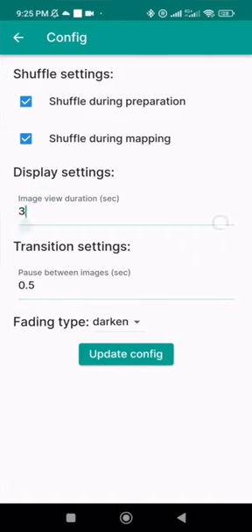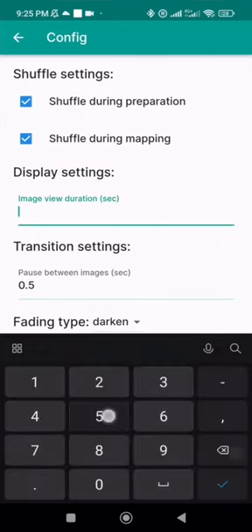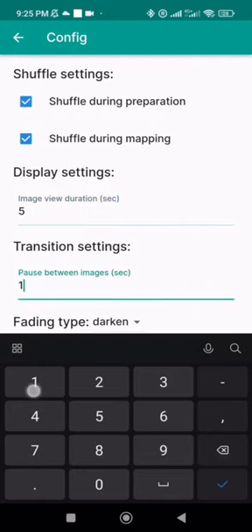Demonstration parameters can be tuned to the examination protocol of your institution. The picture's demonstration is automatically randomized.